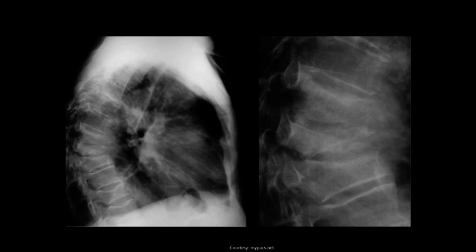Here's pathologic collapse. So here's a vertebral body. This is a vertebral body. This is a vertebral body. And this is a vertebral body. We've lost multiple end plates. Disc planes are relatively well preserved. And then we have some vertebra plana in a couple areas. So vertebra plana, or pancake vertebrae. This one I would also call vertebra plana. So they've all lost vertebral body height. They're starting to collapse. And we have that osteolytic destruction there.